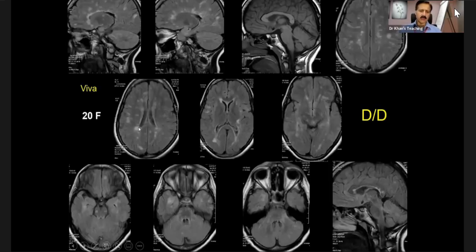Another fine touch is that you have to develop your vocabulary about white matter lesions and how you will describe them. So they can be periventricular when they are touching the ventricle. They can be in deep white matter here, and they can be in the subcortical white matter. So divide it like this. Another thing which is given in the literature, that the plaques of demyelination as in MS, many of them can touch the ventricular surface. On the other hand, there might be up to 3 millimeter distance of white matter abnormality of small vessel ischemia, for example.